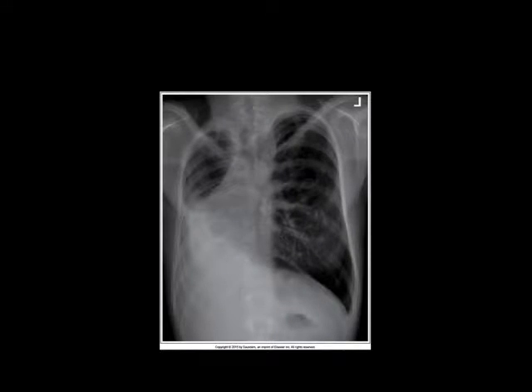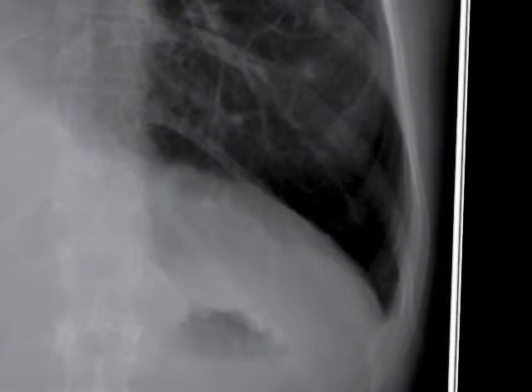So let's look at this image together, and I'll give you just a little bit of time to look at this image and just kind of do the PACEMAN thing yourself. Positioning, what are we seeing position-wise? Area, collimation, how's it collimated? Exposure, how's the exposure? And in particular, as we look at the exposure, let me zoom in just a little bit here, because there is something going on in this image, but I don't want it to distract us from important stuff. We see lung markings here when we zoom in there.